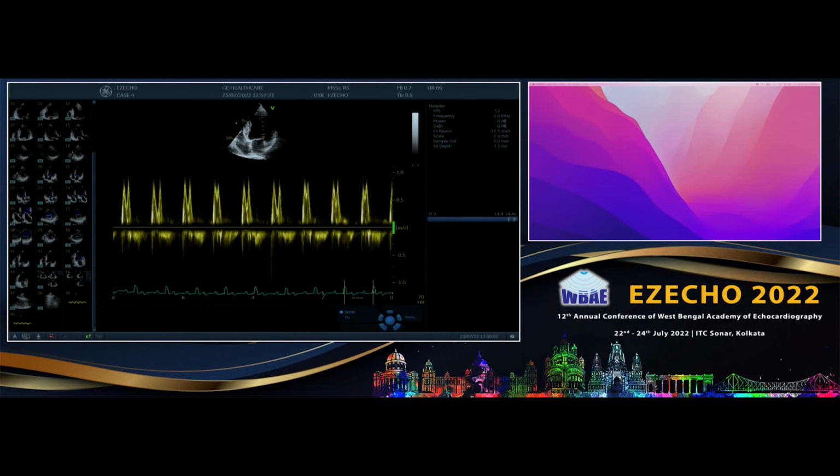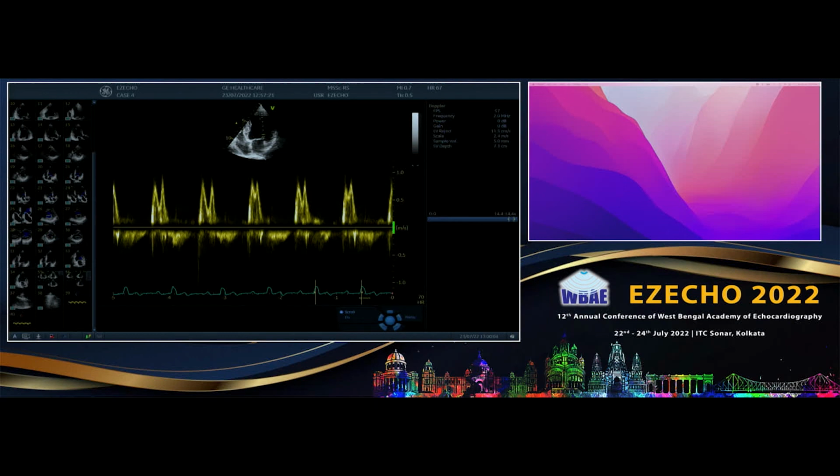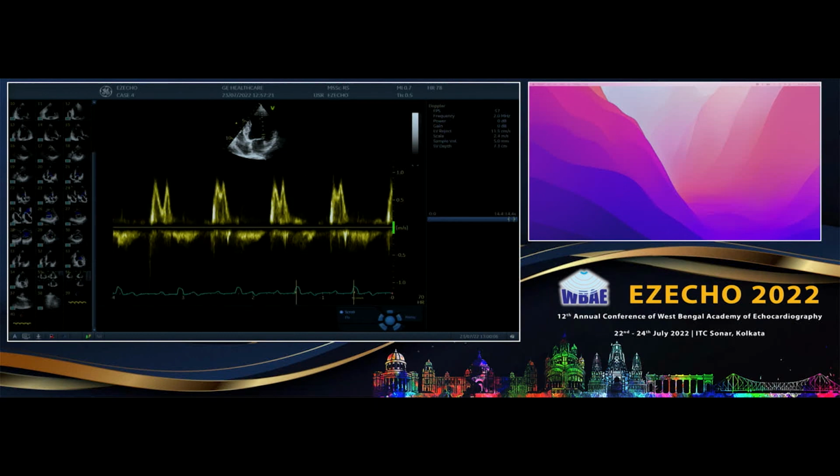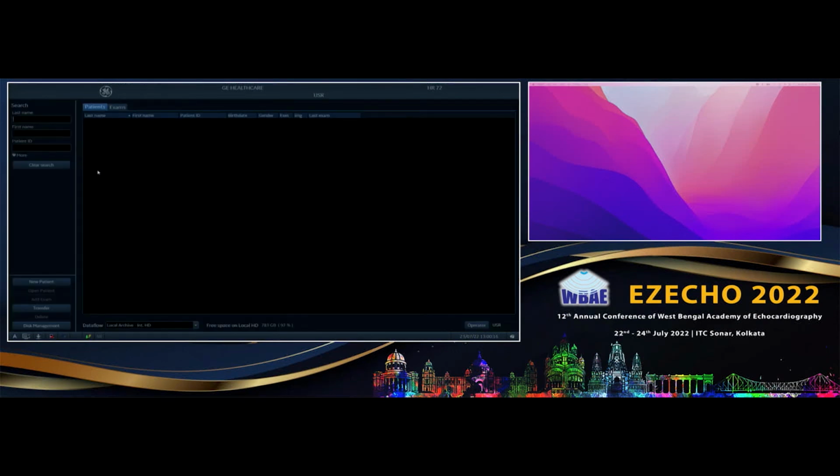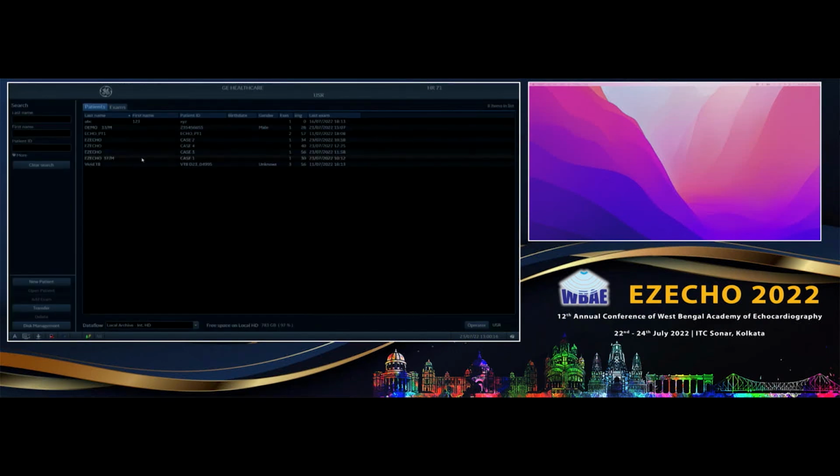Another thing is that IVRT, I think Dr. Nitin has used. Actually, if you go back to our mitral stenosis AFib patient, he had a lot of variability in E waves. Yeah. And then also you saw on the AR PHT that the deceleration was very slow. So we already knew his LV filling pressures are low. So that is how you can put the two things together.